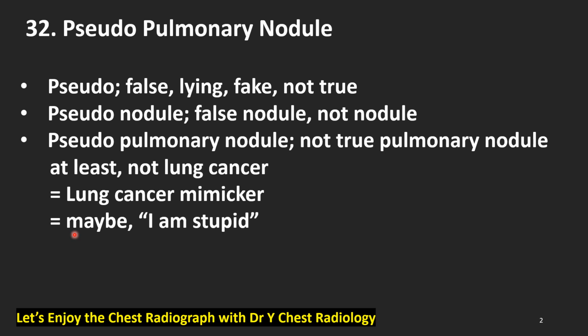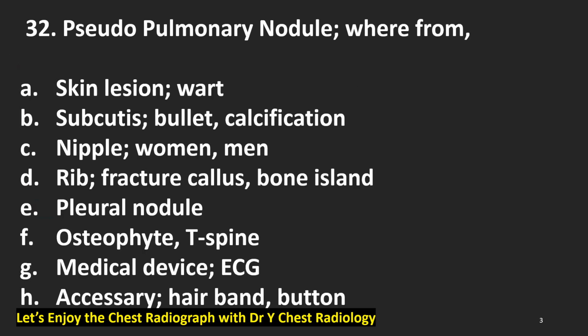When we say the term pseudopulmonary nodule, maybe we confess that I am stupid, because it is clear. This is nodule. This can be malignant. That is the point. If there is pseudonodule, it is simple to say this is not a nodule. We worry about the possibility of lung cancer. Pseudopulmonary nodule is not pulmonary nodule, but included in the chest radiograph.